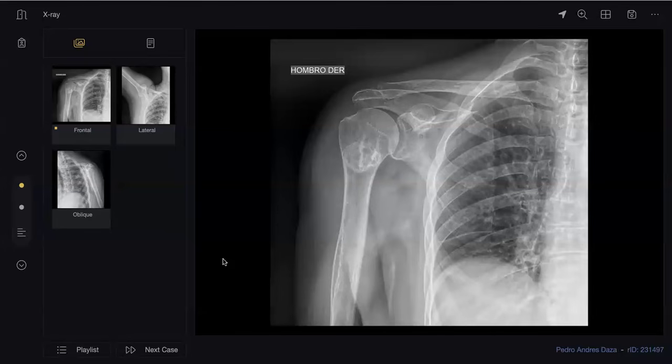Candidate, hi. 8 or 9? You're 8, right? You're candidate 7. Yes, 7. Go on. Shoulder pain.